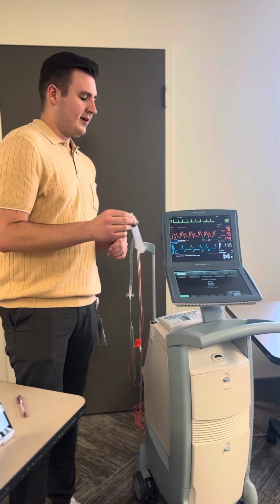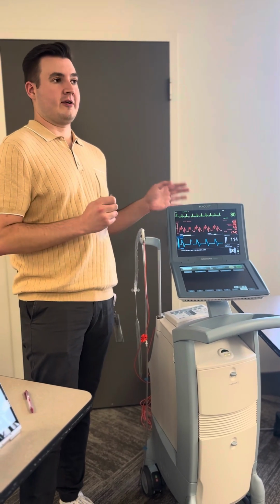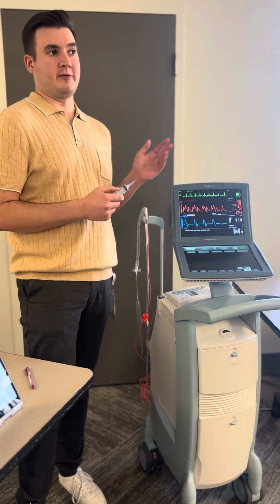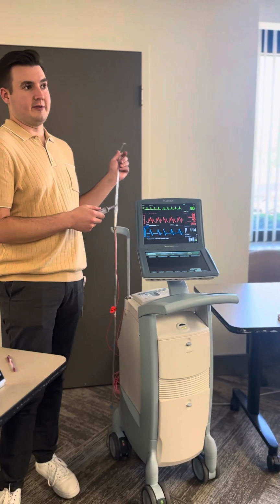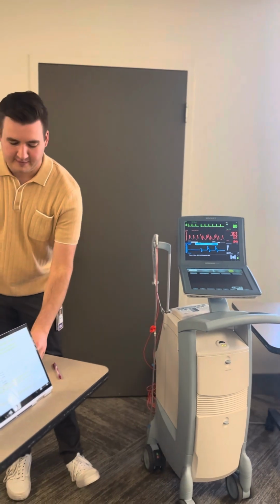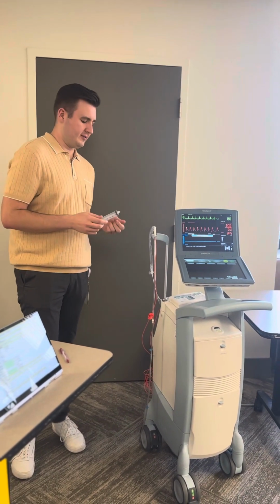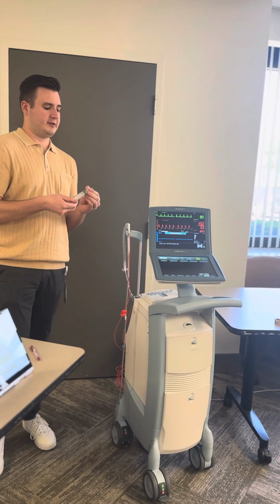So now, if for whatever reason your balloon isn't working, you can't figure out why, you've got a chest x-ray, you've done all this stuff, and you page the doctor and you're waiting on them to come, there's a chance you may have to manually inflate this balloon. So let's just say it's not working, it's in standby. In our kits, it comes with this little stopcock and a syringe, just a 50 ml syringe. You can hook up to the stopcock. It's actually right here.